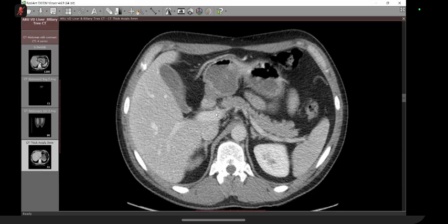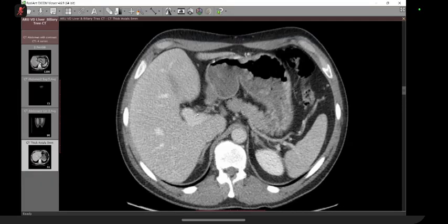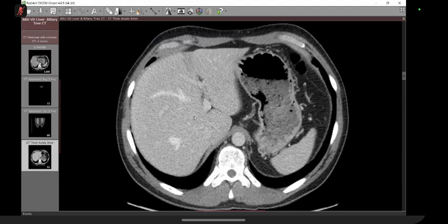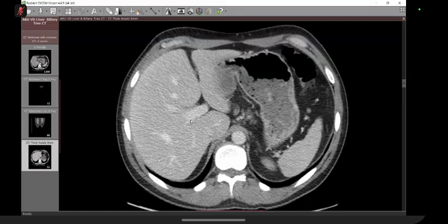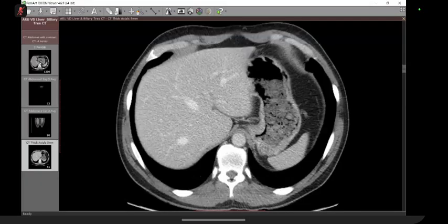Now, this is the portal vein. It goes in. This is the porta hepatis. And then the left portal vein and the right. And you can see that it gives branches, etc. Intentionally, I have not taught you. I put the slides there, and then I thought it will take me another 20 minutes just to teach you the segmental anatomy of liver, which the surgeons love.